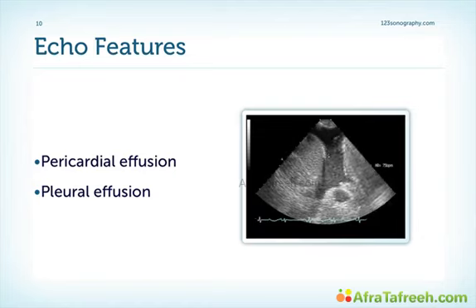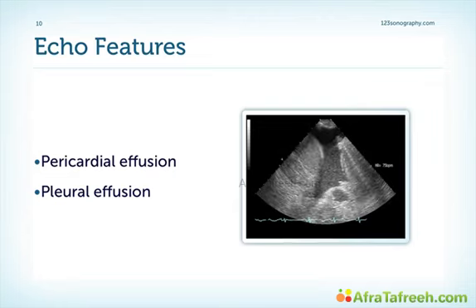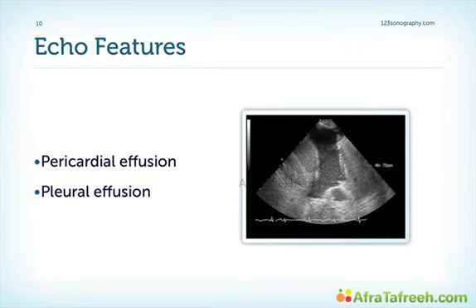Usually pericardial and pleural effusions mark a more advanced stage of the disease and seem to be associated with a poorer prognosis. In general, patients with amyloidosis have very good image quality simply because they have such an echogenic myocardium and because of the pericardial effusion. So you will see these patients very often also at various presentations or on covers of textbooks.